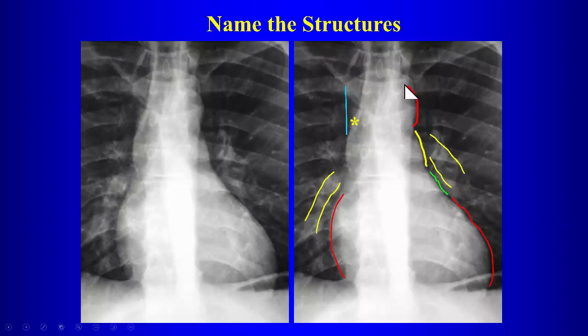Now here we have three bumps, these three mediastinal moguls that are roughly about the same size, and you do have to know what these are, and you should carefully look at these on every chest radiograph. So the first one is the aorta, that's the aortic knob here. The second one, the main pulmonary artery, and the third one here, the left atrial appendage. And below that, the rest of this border is made by the left ventricle.